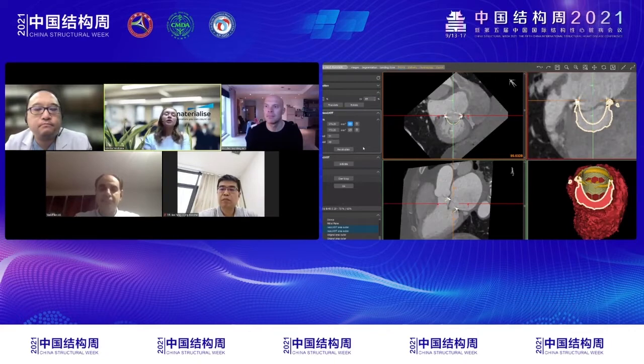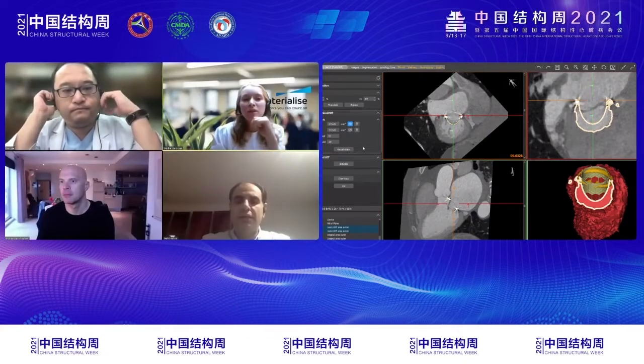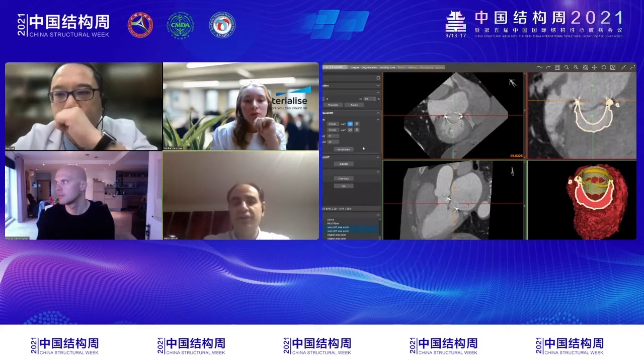Yeah, so the first question, it is indeed an AI-based algorithm. So what it actually will do is it will seek for the plane that is the smallest by going over all possible planes located on the center line of your aorta. So yeah, can you repeat your second question? It was something about volume and segmentation, but I didn't understand it. Yeah, I think it's a volumetric segmentation as opposed to the center line segmentation in your case. Can you comment on this and show the difference?